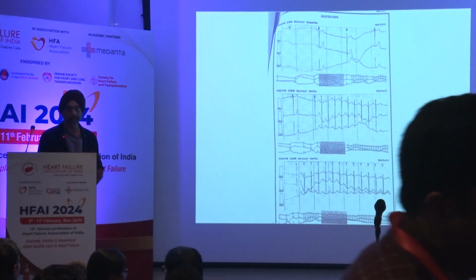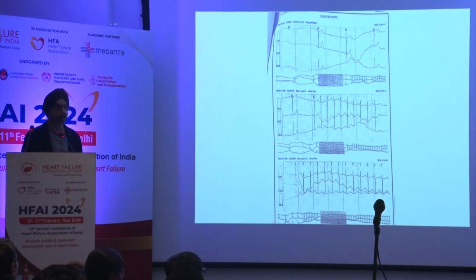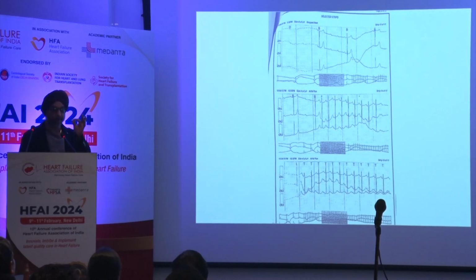To distinguish between these two conditions, if you look at this PP interval, it is not that long. In a vagal reaction, you have to have sinus bradycardia in addition to an AV block. You cannot have it otherwise. So paroxysmal AV block is a dangerous condition, happens in young individuals, and it lies in the intrahisian pathology. In this patient, we could prove that there was a block in the intrahisian region. There were 2 H potentials at the His level. She got a pacemaker about 6 years back. She has used it very few times. It happens very occasionally, maybe once a year or once in 2 years.